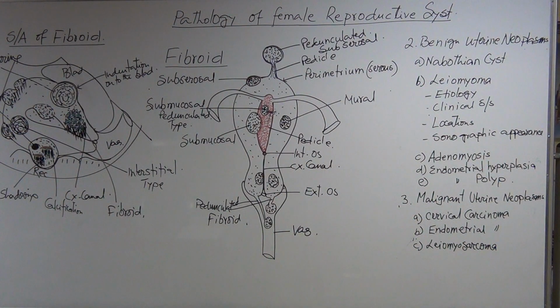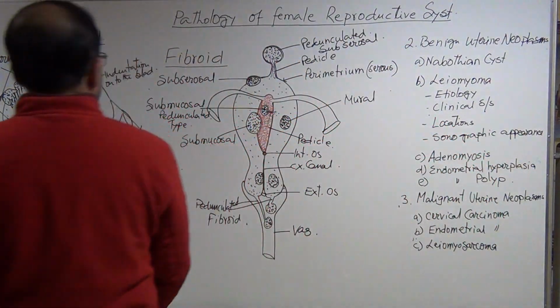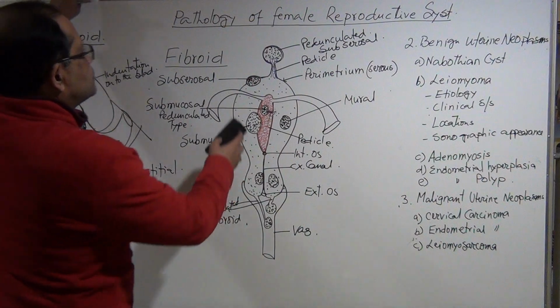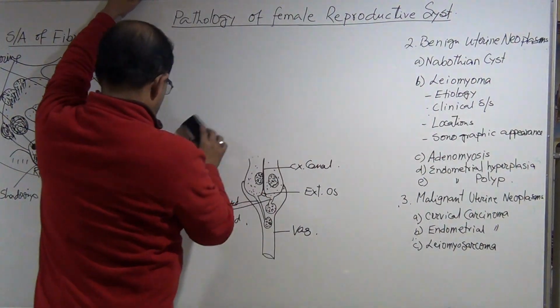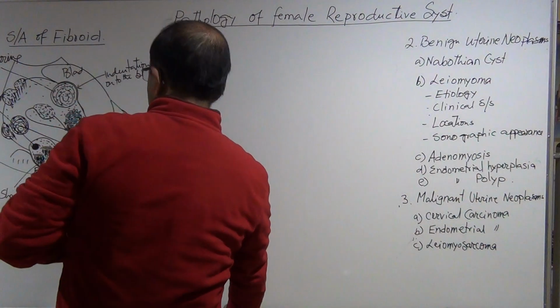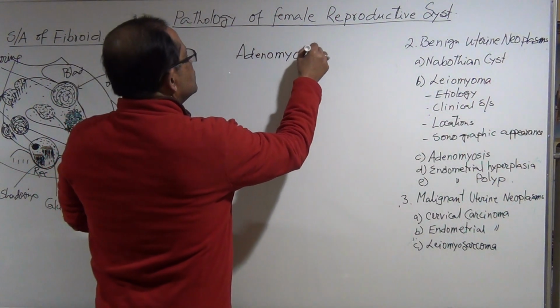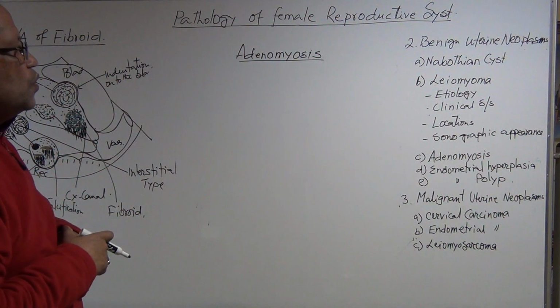Okay, I hope you understood the sonographic appearance of the fibroid, and now I will go over the adenomyosis. Adenomyosis.